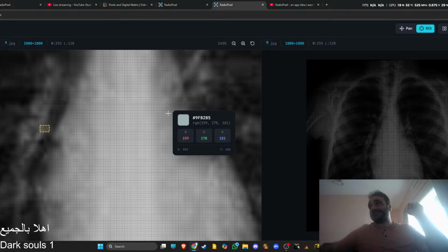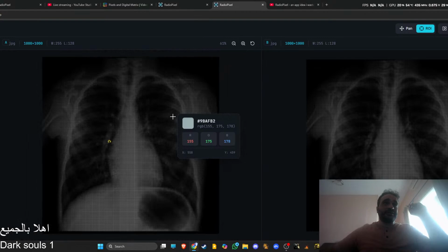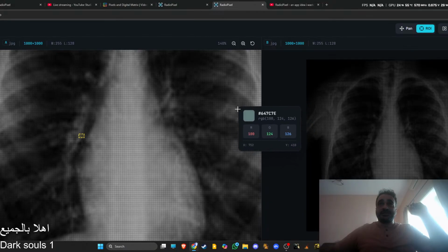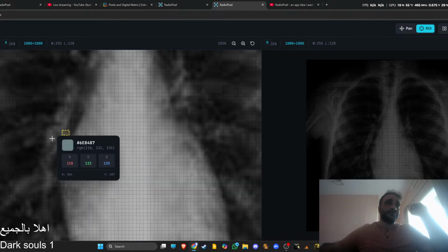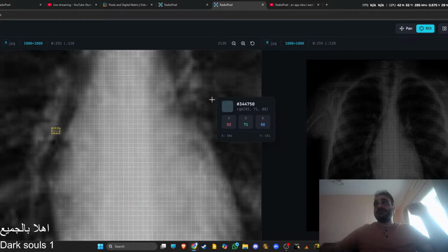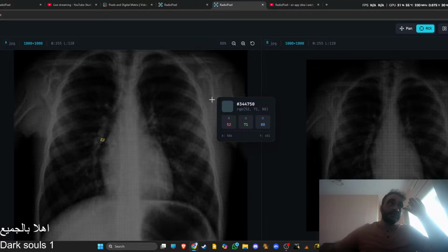The thing is, it's really working. You can upload the images and it will apply this square grid, and then you can go around and get the hex color or the RGB distribution. But I'm thinking about the next step, what should be added.